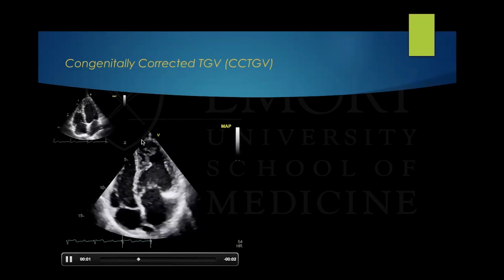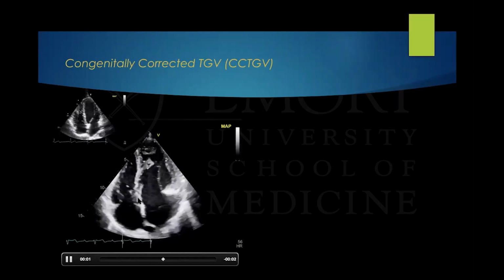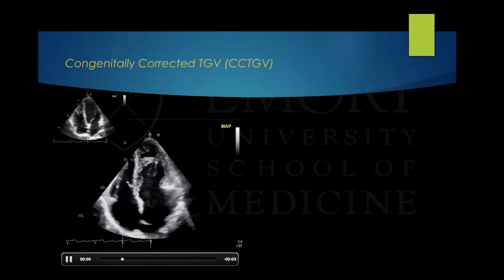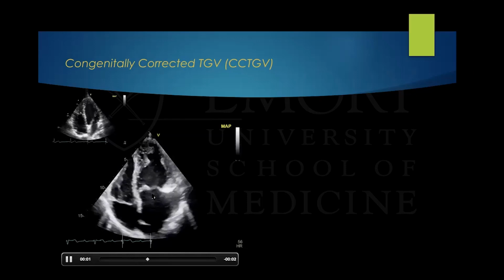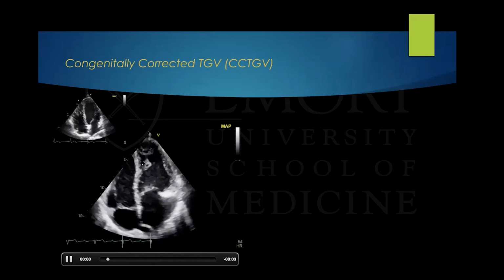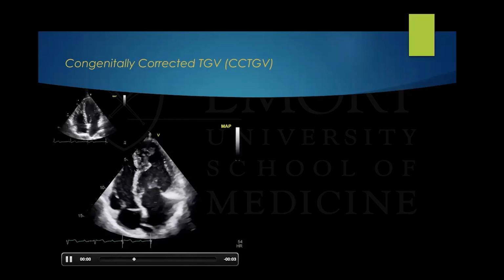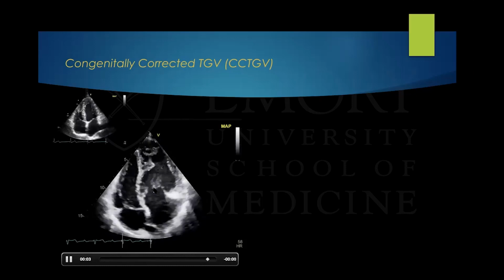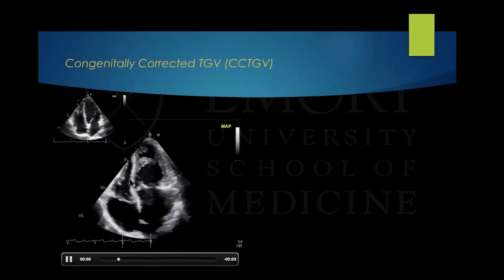And you know that this is a right ventricle for several reasons. One is that there is apical displacement of this AV valve, and that is a tricuspid valve. The tricuspid always goes with the ventricle. The AV valve always follows the ventricle. So this is the tricuspid, follows the right. This is the mitral, follows the left.